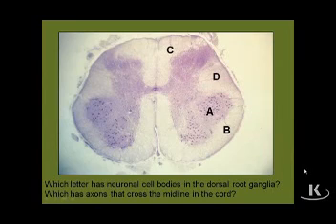that appears on your computer screen is recognize where you are, because obviously that could be relevant and could be a participating factor in the answer. So what we're looking at is a Nissl-stained view of a spinal cord section. Our first task is to identify generally where the spinal cord section is from, because where it is may have some impact on the answer choice.